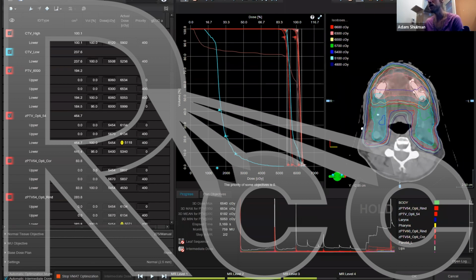I really just want this to go ahead and complete, so we can calculate the dose and just take a quick look for a few minutes. Any other questions? We probably got about 5 minutes left before this finishes up. I think we have one.